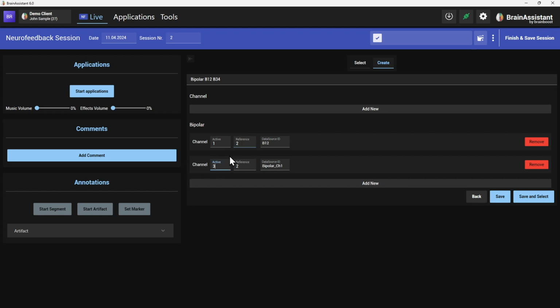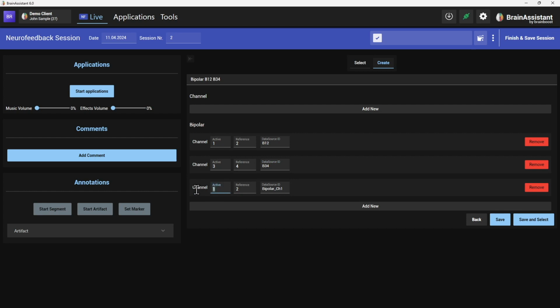Now I want a next pair. So what is the next one in line? Active channel 3. And what should be the reference? Well, 4. I have a graphic that will show you that, but hopefully you can follow. So active channel 1 takes 2 as a reference. Active channel 3 takes 4 as a reference. Of course, you can say, wait a second, channel 5 is my active, but it also takes channel 2 as a reference. I would name it now 5.2.